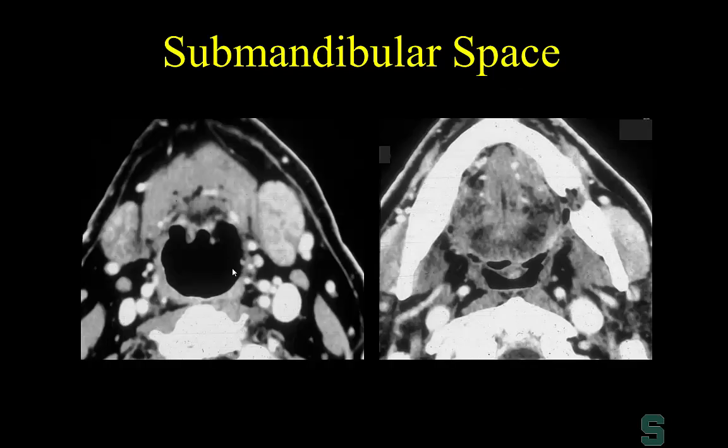And another example here, this was a tough case. Here we have enlargement of the left submandibular gland. Now, this was a case that came a few years ago. This floor of mouth CT is the exact same patient that's associated with this. So this is a little bit subtle, but you can make the diagnosis if you know where to look.